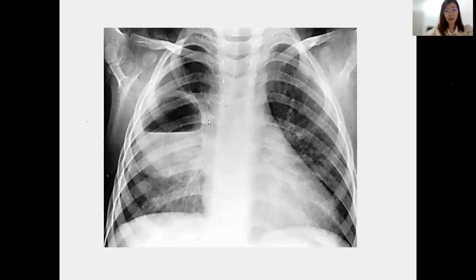So can anyone answer this X-ray, the easy one? Okay.